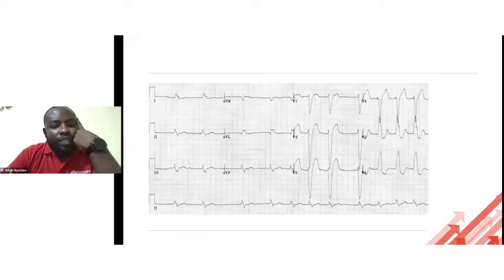So we've moved from STEMI equivalents. We are now into what we call STEMI mimics. So these are ECGs that mimic ST elevation myocardial infarctions, but they're not truly myocardial infarction. So they're called STEMI mimics. This is the first one. Comes with pain.